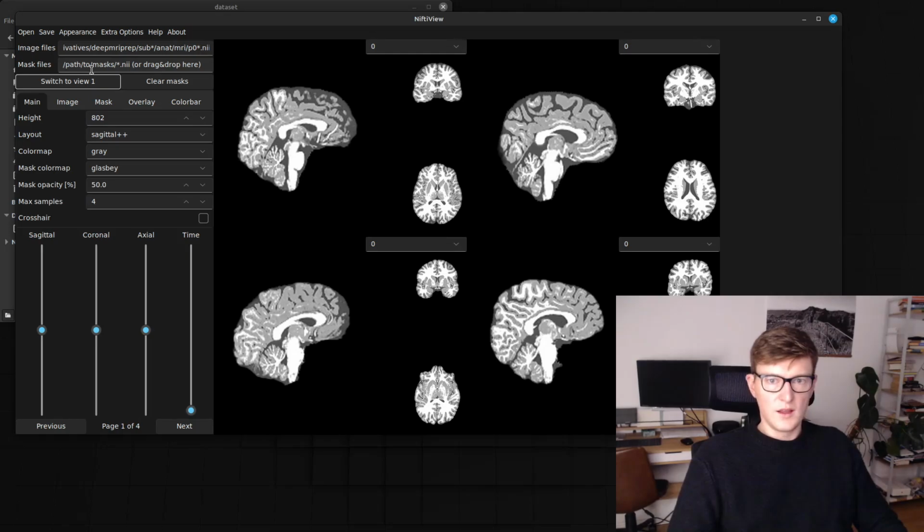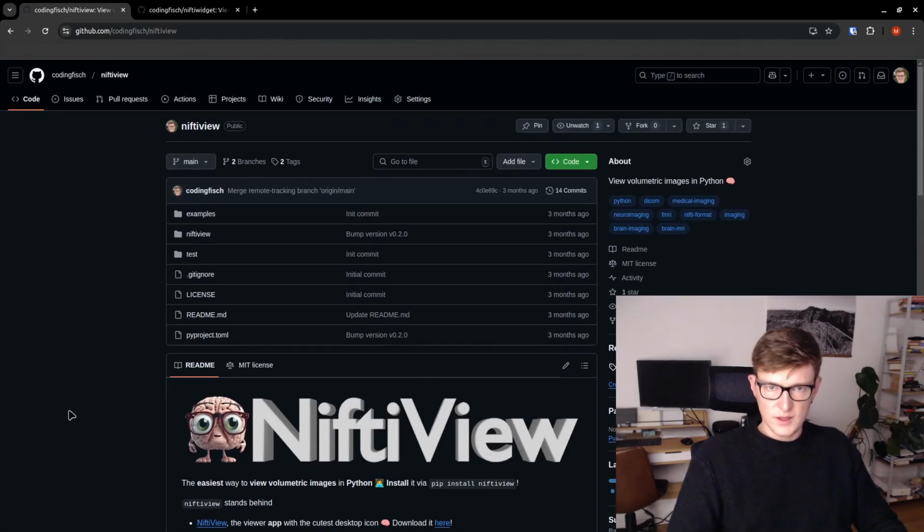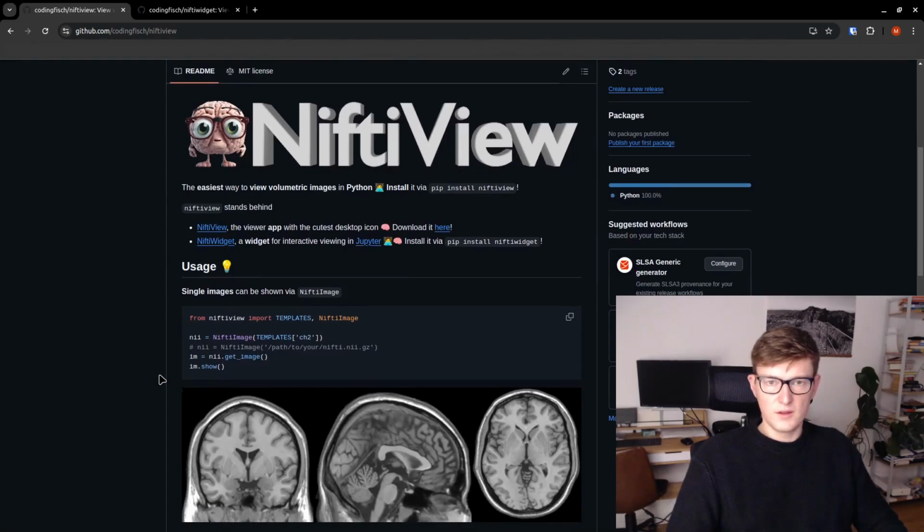And the last 2 features I want to show for the coder section: you can actually use the Python package NiftiView the app is built upon. This is much easier for people using Python.